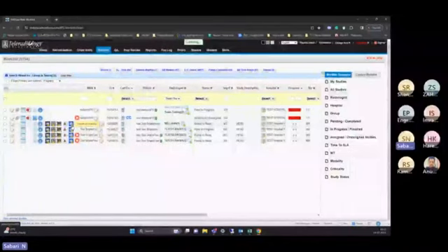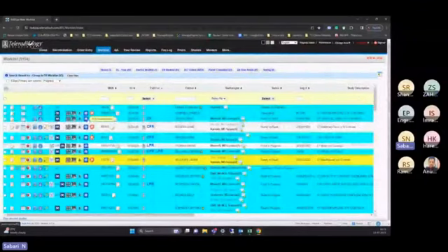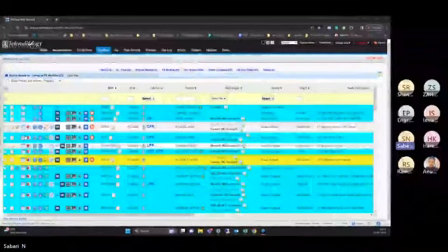So here I'll take the scan. When I click on the blue RADSpa new viewer icon, these images will open in the DICOM viewer, like a Radiant viewer, Microdicom, or Marian viewer. And if you talk about Mac, there is the Osirix viewer, and all those things will come into the picture. So in our application, I have clicked on the fourth icon of the third study.